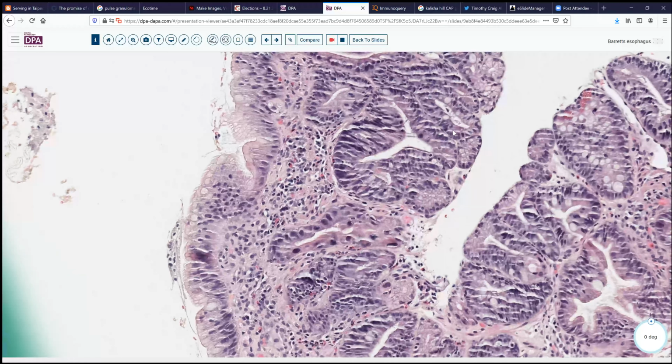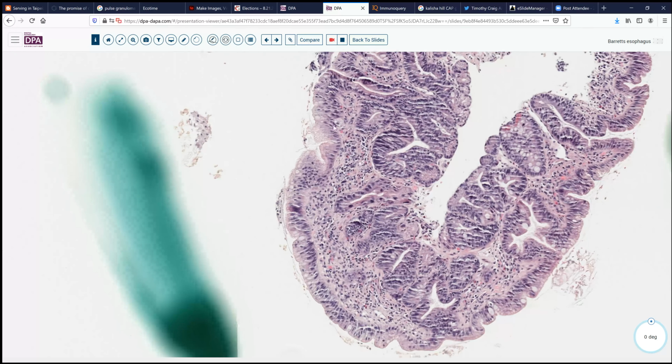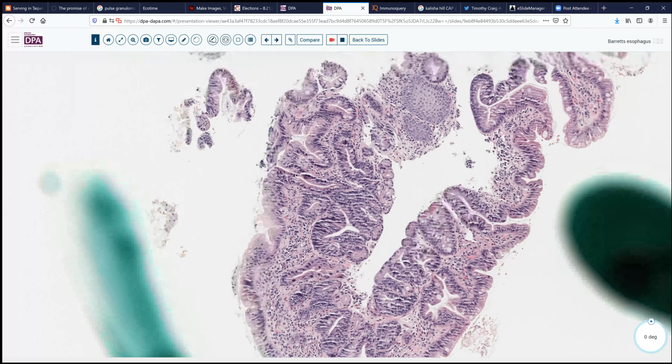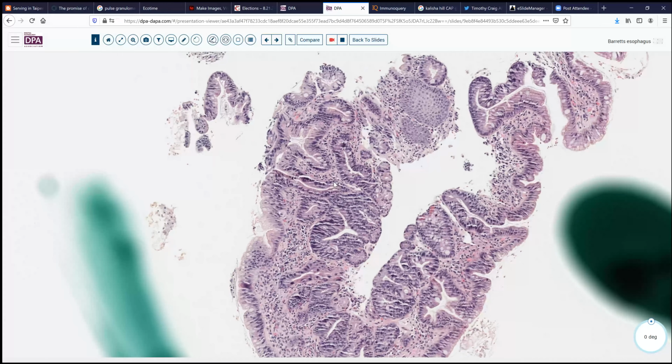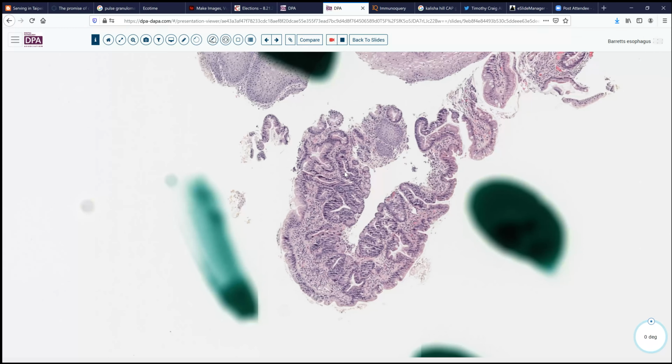In most observers, this would not qualify as dysplasia, because it did not reach the surface. But it certainly puts you on notice that you should be looking for that possibility. In reality, this may represent the earliest stages of dysplasia, but not having reached the surface, it would certainly not be at the stage where more frequent follow-up would be warranted in these patients.